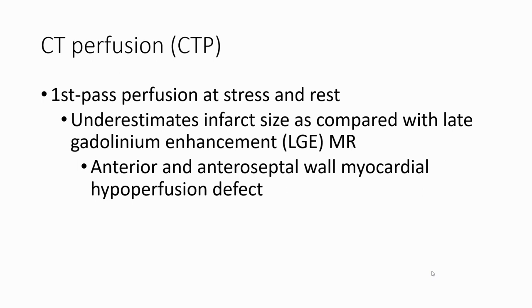CT perfusion: stress and rest perfusion may underestimate infarct as compared with late gadolinium enhancement MRI. Anterior and anteroseptal myocardial perfusion defect.